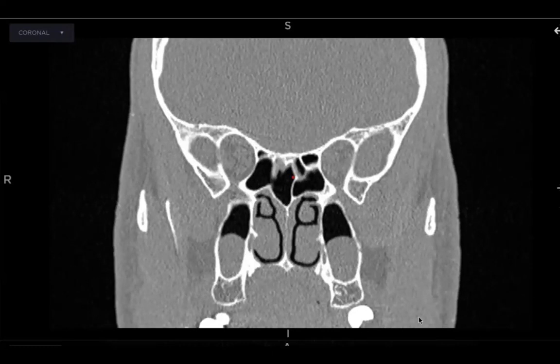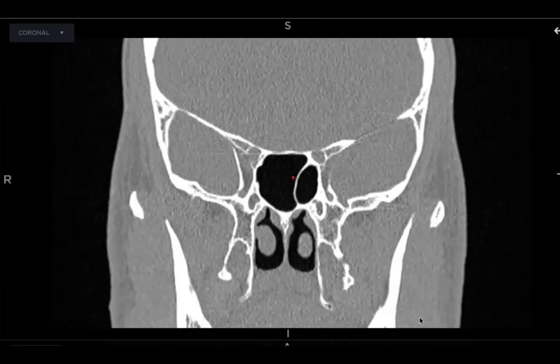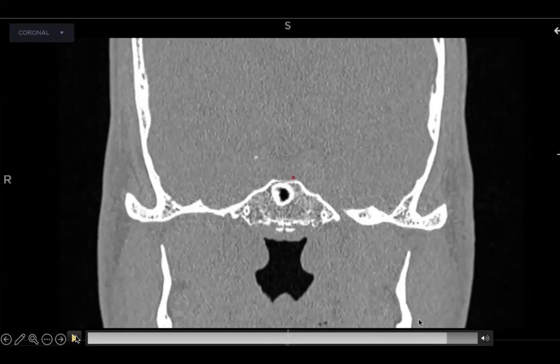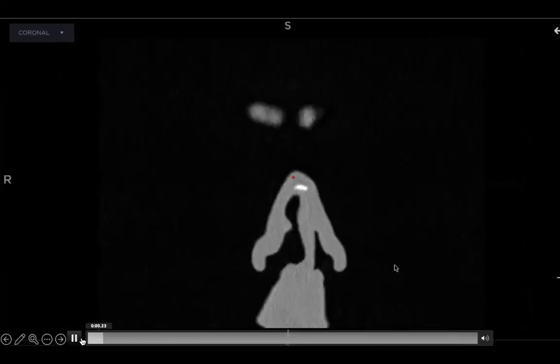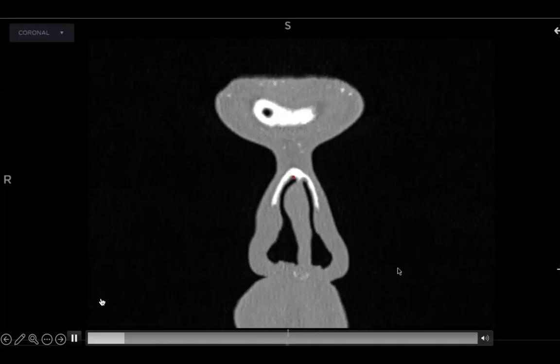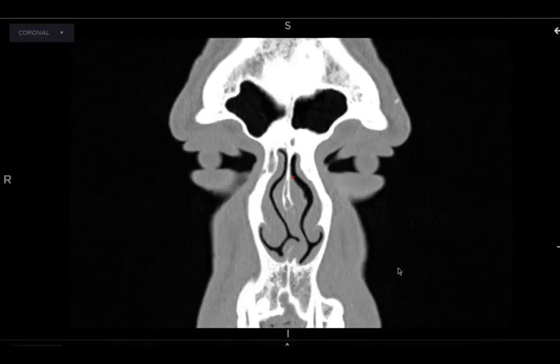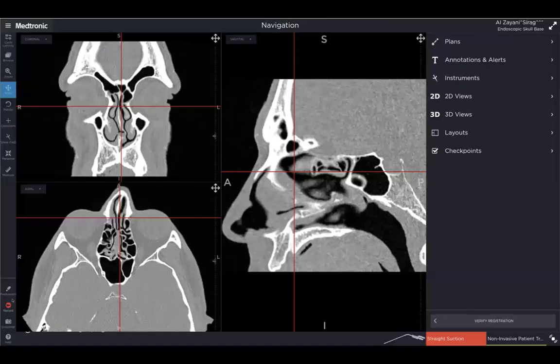But I just wanted you to look at that CT scan, and I'll show you the scan again from the front. And if you look at this scan carefully, you realize that there's a lot of salient features here.